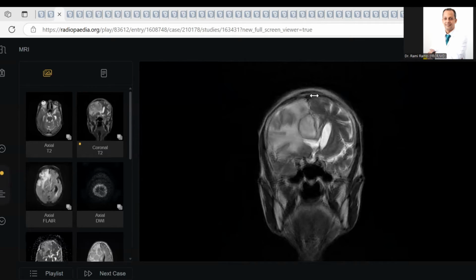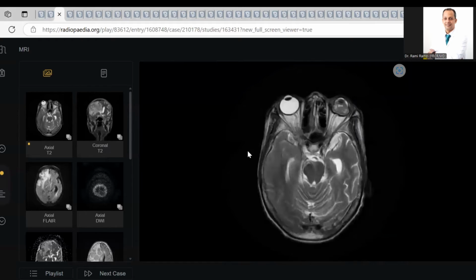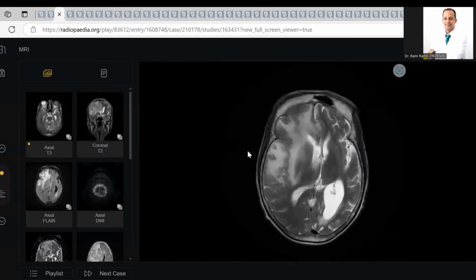I think there is uncus herniation, but I would like to see the temporal lobe. Time's up. Thank you. Okay. Thank you. Most welcome.